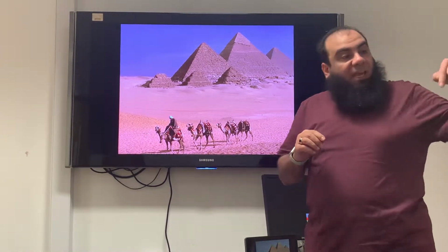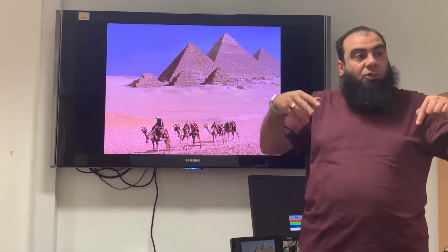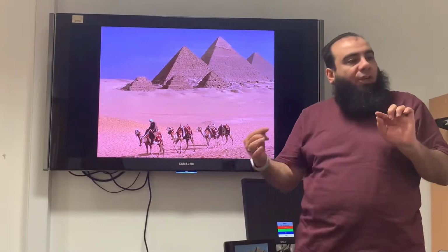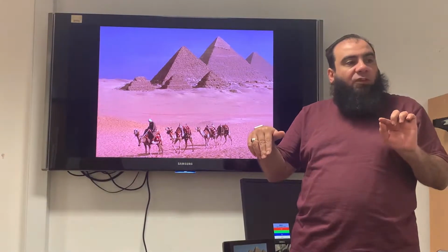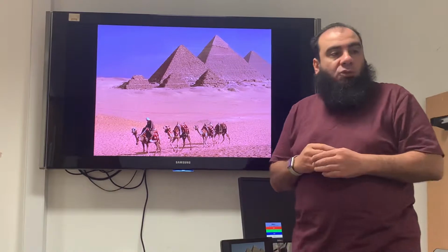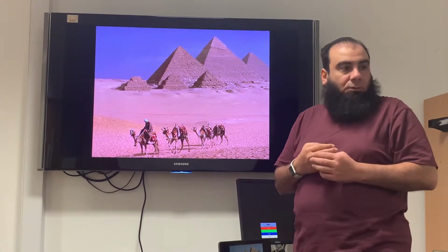But if it came with other inferior leads, for example lead 2, or all of the 3 have been involved, it means it is pathological. But a Q in lead 3 alone is not pathological. It could be a normal variation.